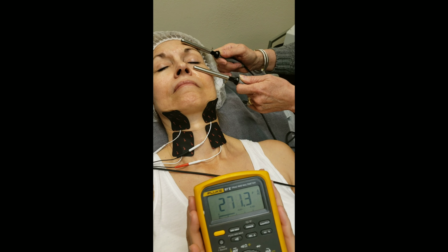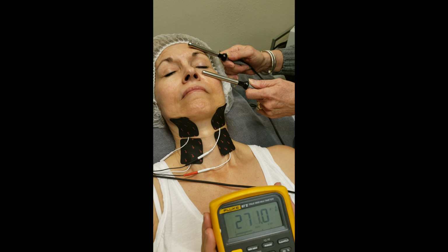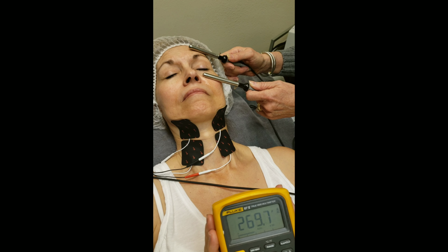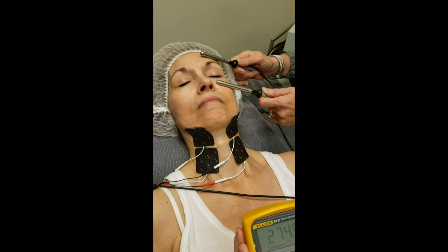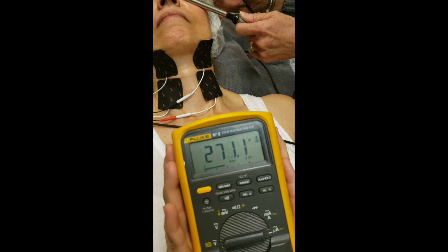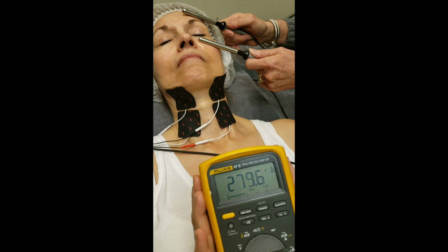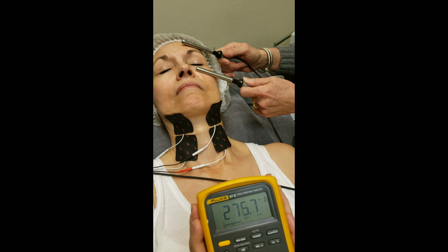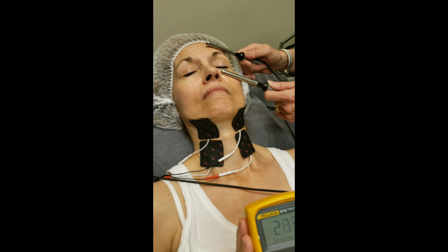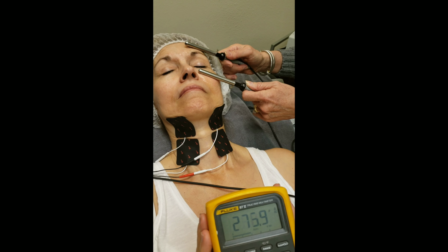So we're losing about 50% because of the face pads connected to the same channel via port 1 and port 2. So now we're going to show what we mean by skin impedance monitoring and how, through a complex algorithm, we can output perfect levels based on the amount of skin surface we're treating with the other machine, the NEUROTRIS machine that has skin impedance monitoring. So let's hook up that machine.